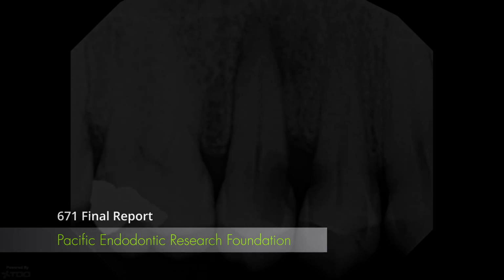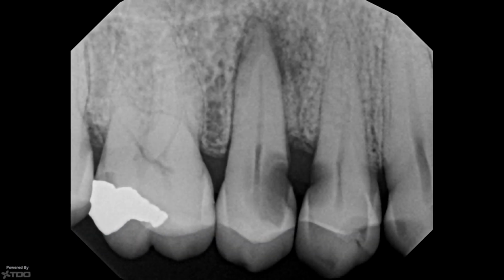Let's take a look at the case report, number 671. A middle-aged Caucasian male patient was seen at my office for a severe toothache on the upper right quadrant. Here is the radiograph of the area.